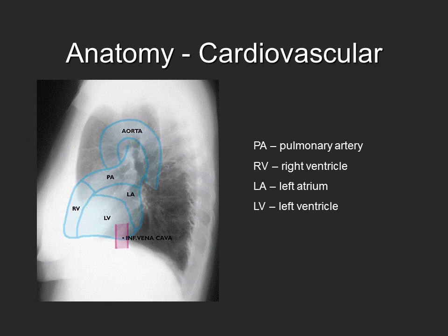This is a lateral view outlining the cardiovascular system. Notice the ascending and descending aorta.